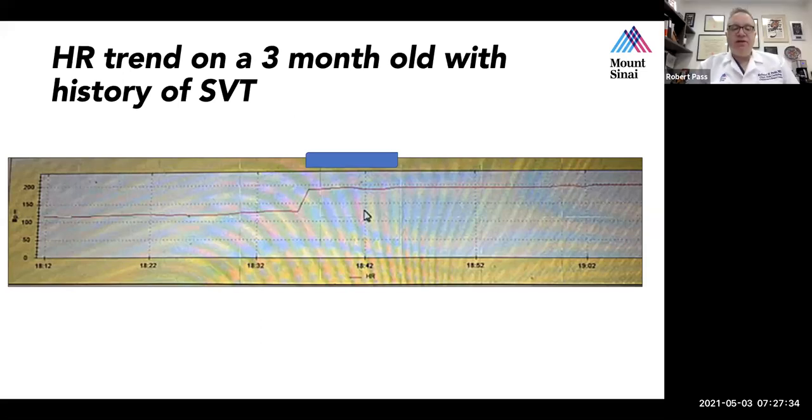That's exactly right, David. And in fact, you might be fooled because the slope seems to be a little bit, it's not quite straight up in the air, but that's a reflection of the time scale. Notice the entire time scale here is only 50 minutes in duration. So time has been expanded, and it looks slower onset than it actually is.